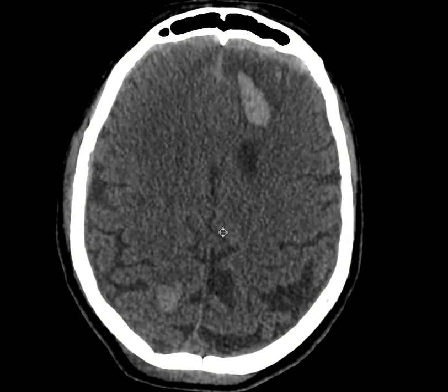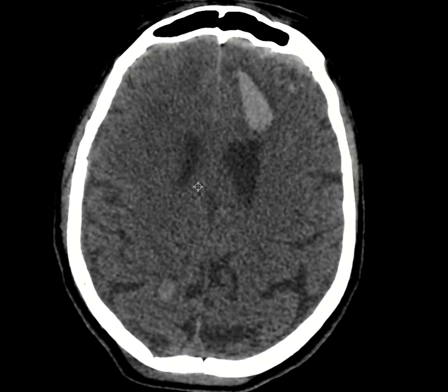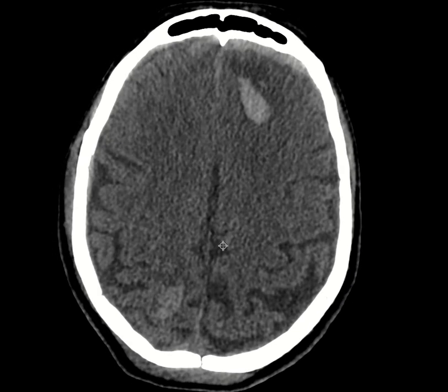It's not just enough to say there's hemorrhage. We have to characterize these hemorrhages, and it's important to know what type of hemorrhage we have because they have different prognoses for neurosurgery, and we have to measure the hemorrhages. Some of them I will tell you which ones you need to measure because they are also important. They can grow fast, and they need to be followed up in a specific time window in order to make sure the patient is stable or getting worse. So we have to make sure to put a detailed report for our providers.